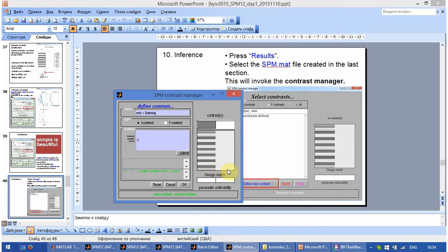This is the baseline mean contrast, and typically we never manipulate with it because all the fMRI designs deal with relative alternation, not the absolute signal which is encoded here. We are not interested in the absolute signal intensity.